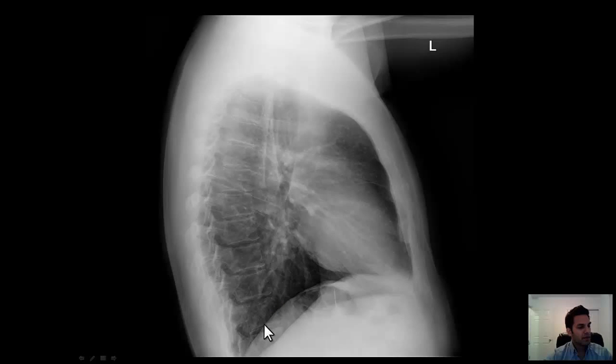Basically, after we do the abdomen and check the costophrenic angle, we're going to go up the spine, make sure the vertebral bodies have a nice height, all the disc spaces are clearly seen, and there are no osteophytes and no fractures. And then once you go up, you're going to come down the anterior side. You can see the manubrium and the sternum very well. Then you're going to come down the mediastinum.